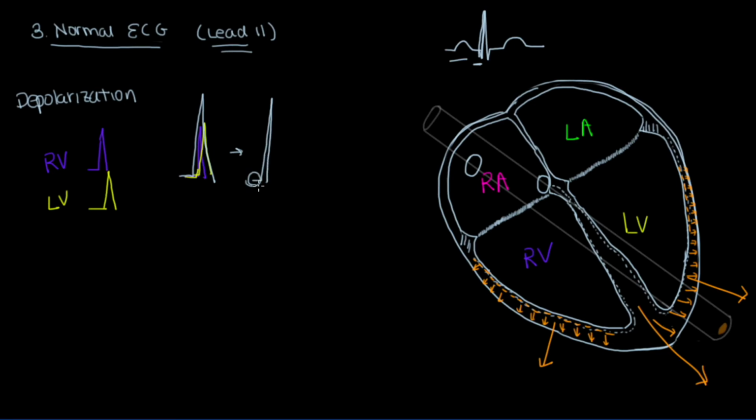But remember, I wrote this at rest before, but as we looked at earlier, when the His-Purkinjes were moving this way, it had a little bit of a negative deflection. So in reality, it's coming from a negative deflection upwards like this. And that's exactly what we're seeing up here, right? We got the negative deflection and then the very large one going up. And then next we got to explain, hey, what is this little blip going downwards here, right?